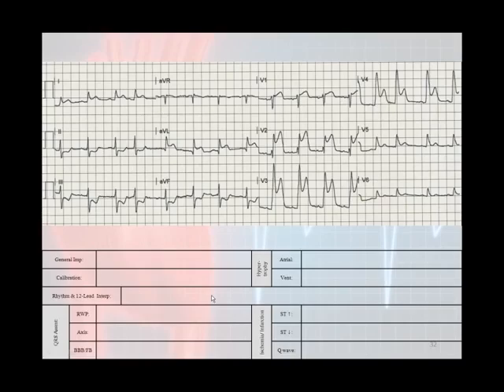Now take your quick glance. Did you see anything that looked excessively fast, excessively slow, or ugly? Hopefully, just by glancing at this, you don't have to be very well trained in the EKGs to know that this right here is a very ugly morphology. It actually looks a little fast as well, so we're going to say that ugly morphologies.